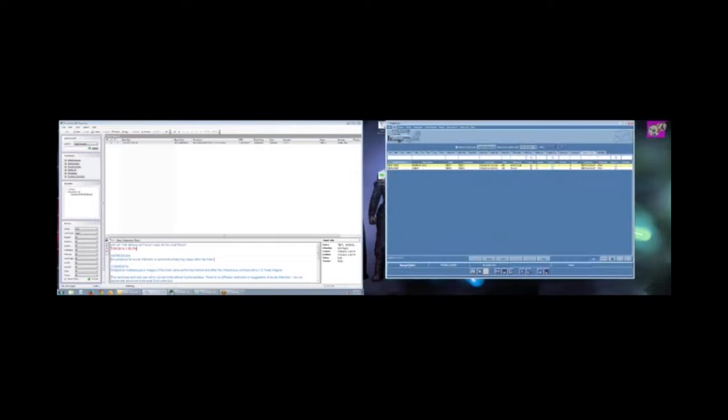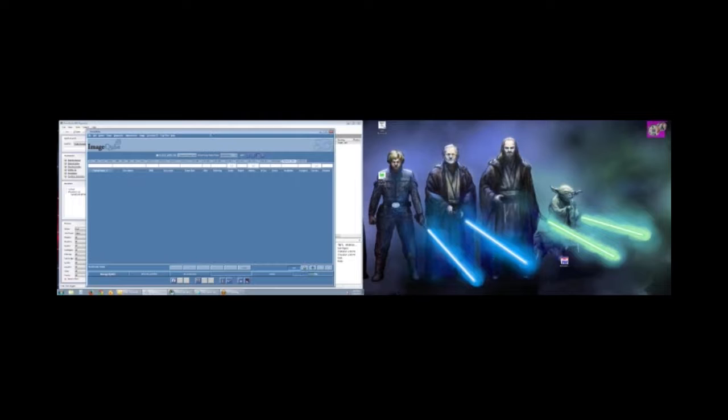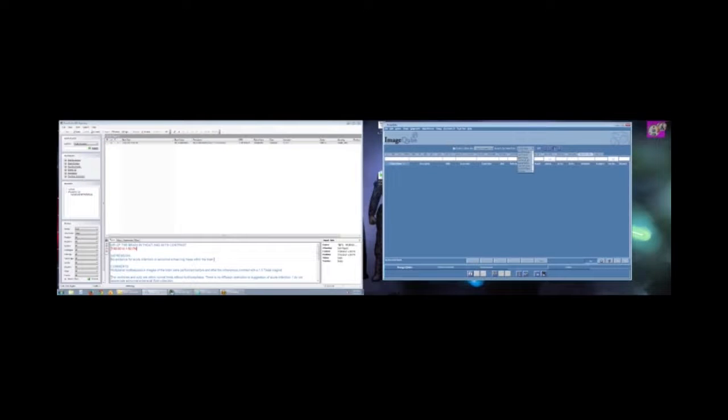We will now close this exam and demonstrate the ability to automatically launch the PowerScribe system based on the ImageQube user's settings. User Setting Control Panel then selects Auto Launch Dictation. And when the exam is now launched, PowerScribe will automatically be launched without having to select the microphone button.